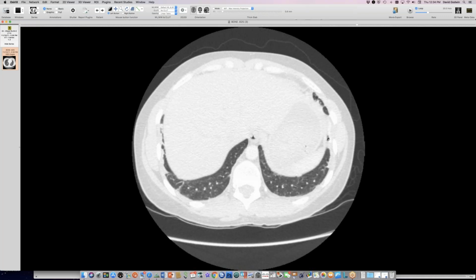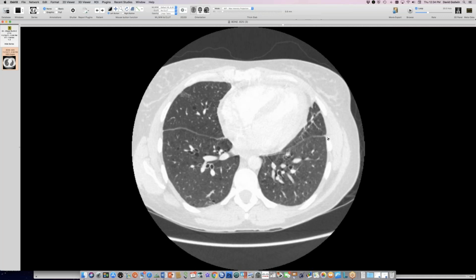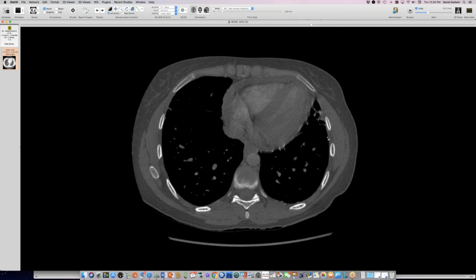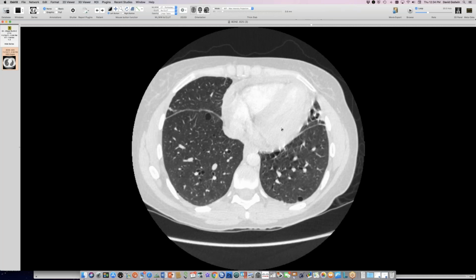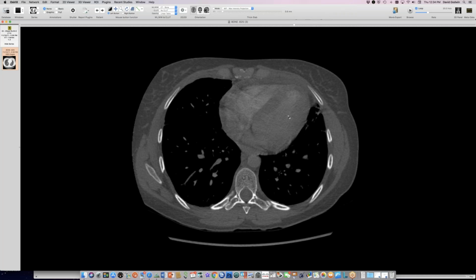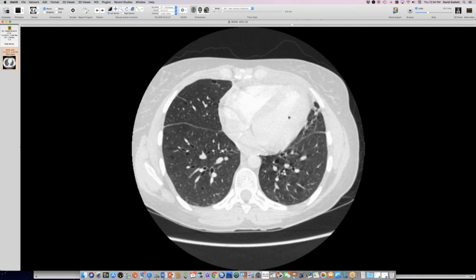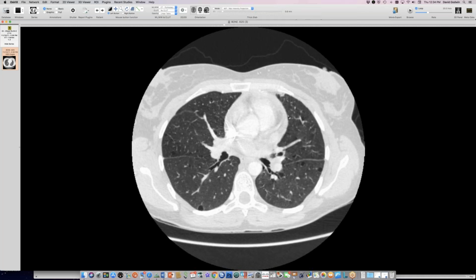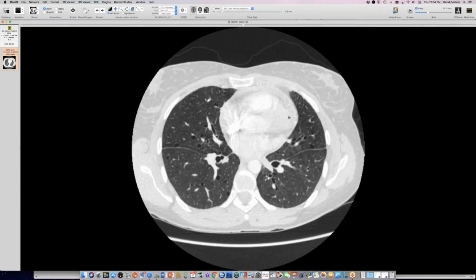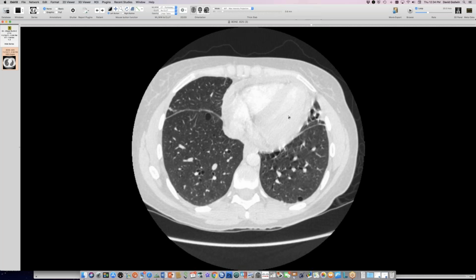Okay. And this person has Sjogren's syndrome, and also has some lupus-like features and has pleural effusion, and at varying times has had pericardial effusion and left pleural effusion as well. So I think we're back to the LIP notion here as the cause of cystic lung disease, and dramatic progression in 8 years and really messy looking cysts.